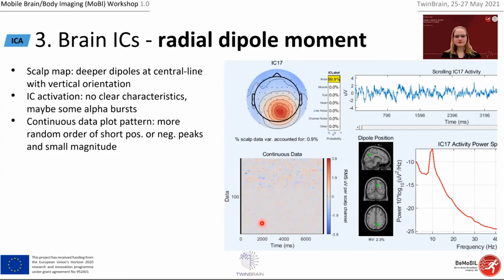The red or blue is not that clear. So I'm not sure why in this data set it becomes more clear in the standing phase. That would be something interesting, but in my experience, this is a usual pattern. And the magnitude is definitely somewhere else compared to the muscle or to the eye movement.